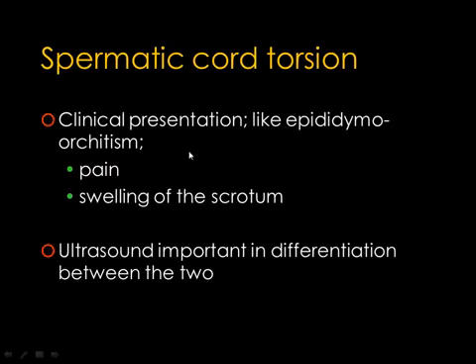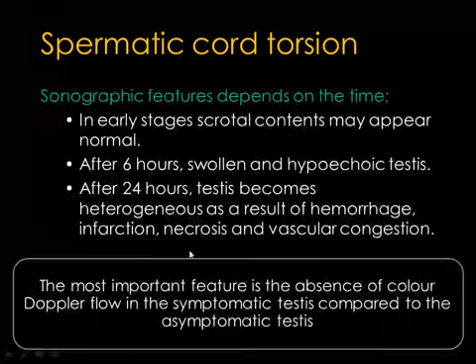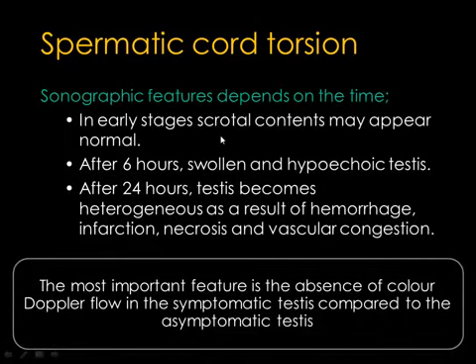Clinically, torsion might present like epididymo-orchitis, with pain and swelling of the scrotum, so ultrasound, especially color Doppler, is important in differentiation between the two. Ultrasound findings depend on the time passed since the torsion. In the early stage, scrotal contents may appear normal.